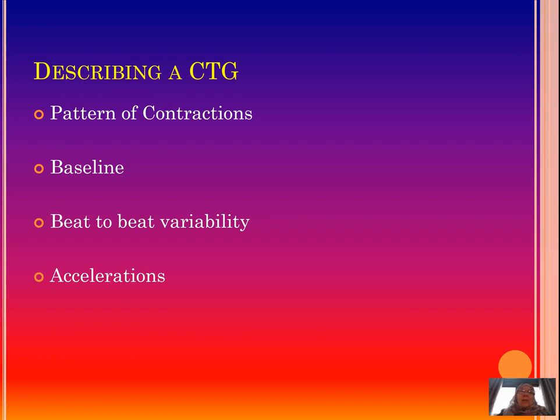You have to see if there are accelerations present on the CTG, and finally also if there are decelerations present on the CTG. And we're going to talk about all of these features that you can find on the CTG in this and also the next lecture that I will be recording for you.